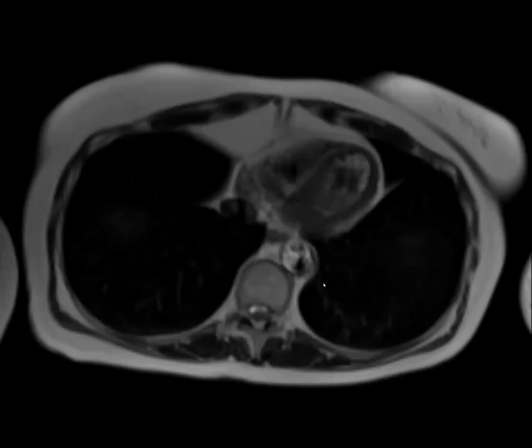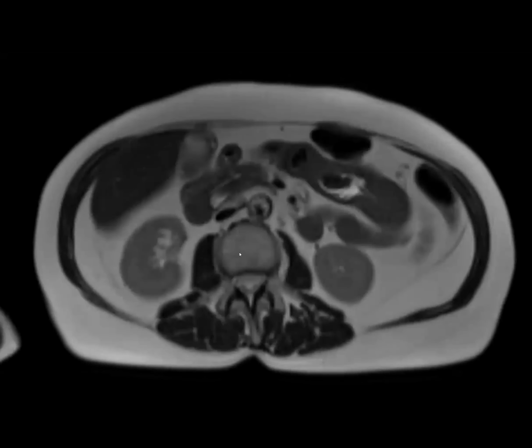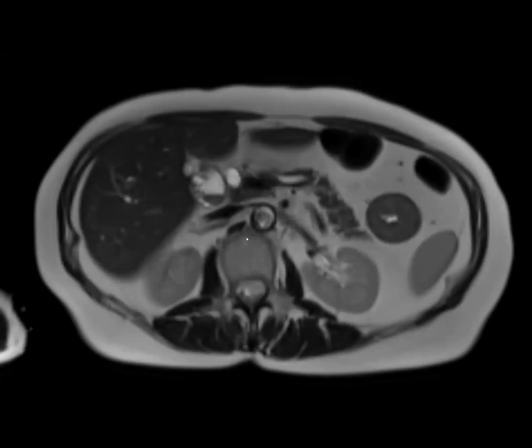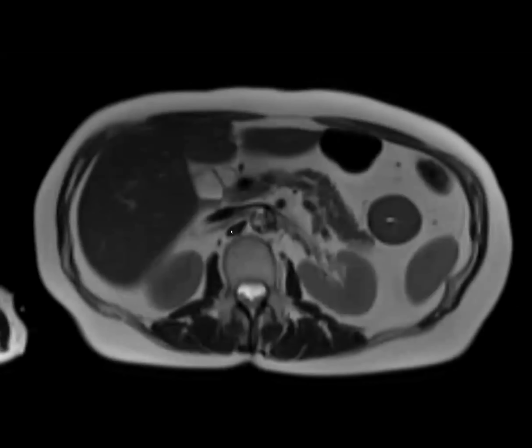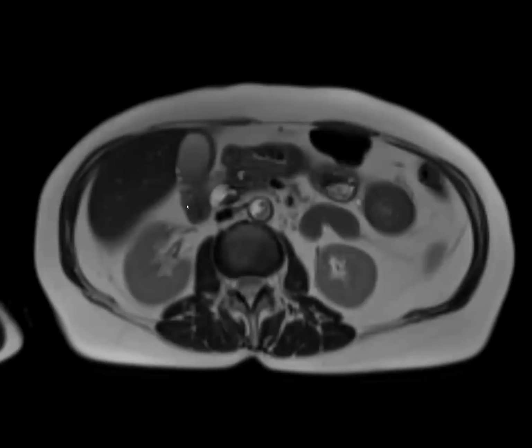I mean, could this also be a congenital multiseptate gallbladder? I've seen that rarely, but seen reports of it at least. Great thought. I have seen a couple of those, but I would say that's much more rare, and usually those have septations crossing the entire gallbladder. So this kind of bubbly cystic stuff at the fundus is more compatible with adenomyomatosis, but I do love the thought.